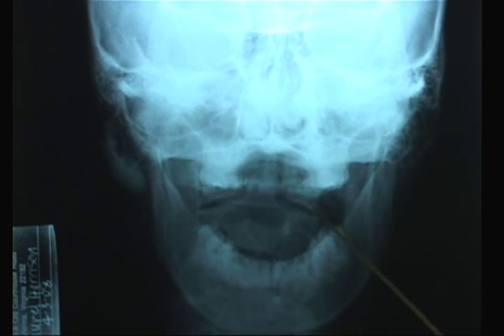You can see that the lateral process of C1 lines up with the lingual cusp of the teeth in the upper arch on the right side, and on the left side it lines up with the buccal surfaces of the teeth, meaning the skull is either displaced to the patient's right or the cervical spine column is displaced to the patient's left.